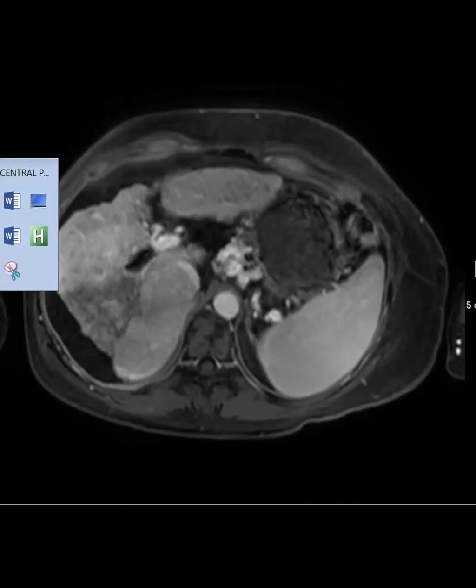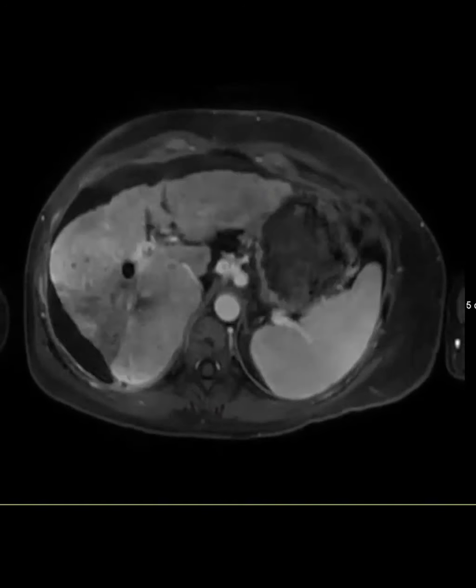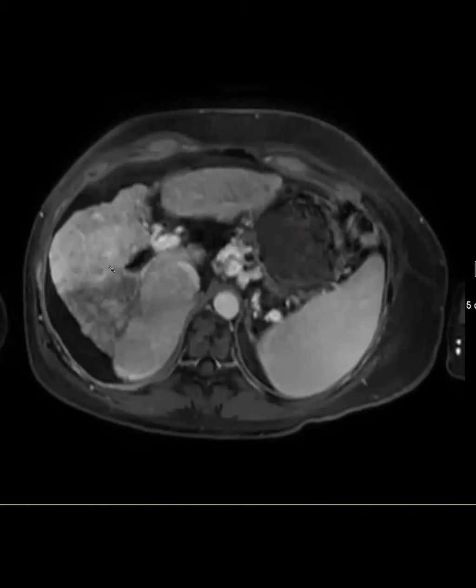Any comments? No, that's a great call. I would have thought the TIPS had just taken out some portal vein or some vessel. I was shocked when it came back as anything. And just to follow up with AFP, this is a path-proven infiltrative HCC, so this is pretty aggressive HCC. The AFP is 24. Oh, 14, I'm lying, 14.